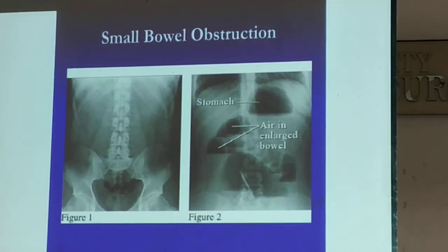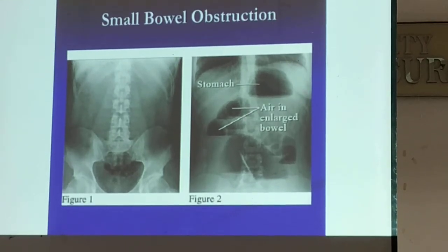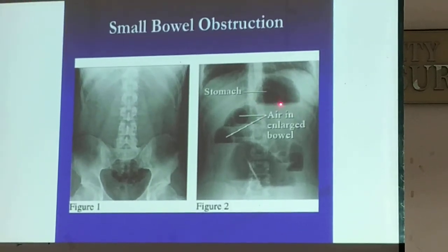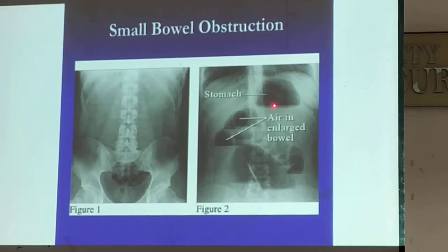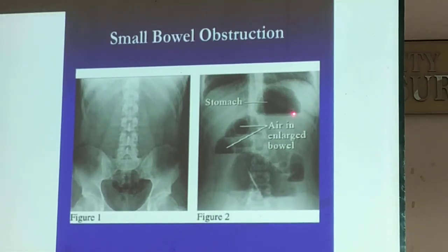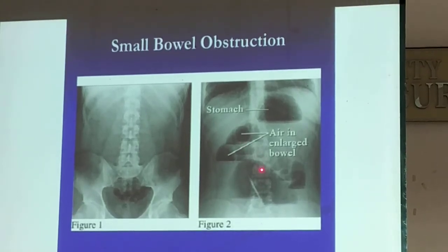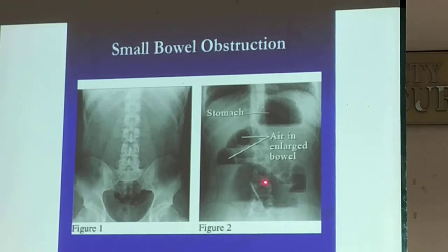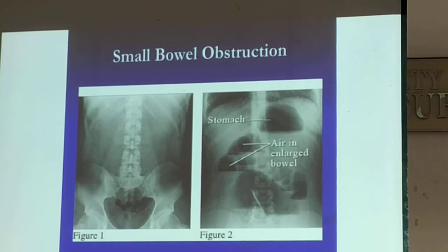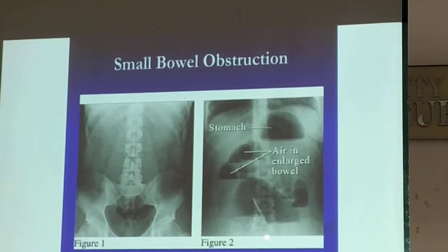This one would be small bowel obstruction. Okay? So definitely, this air fluid here would be your gastric bubble. It's seen just right below your left hemidiaphragm. So this one is located at the center of your abdomen. This is your vertebra. So a small bowel is located centrally.